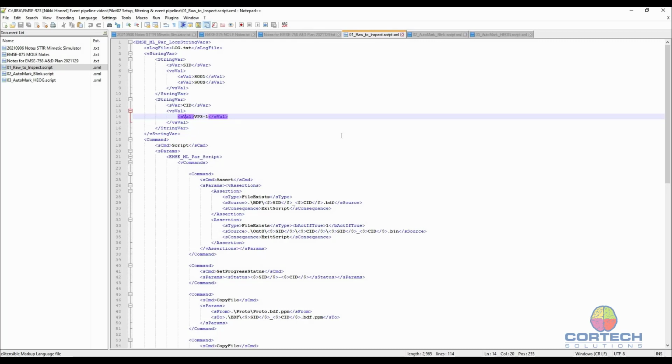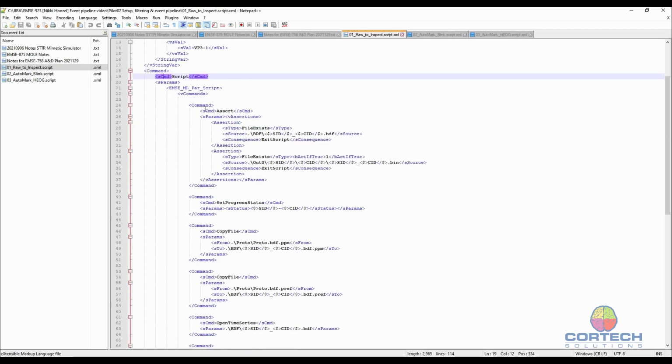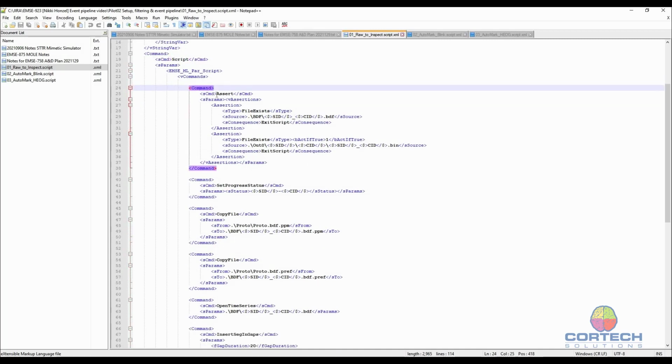So you could certainly add different experiments or condition IDs as well. So this part at the top can be used for looping over participant, experiment, and other variables. And then this part down here is a script that is looped over by these variables. And it's a sequence of commands. So there's something called an assert command.